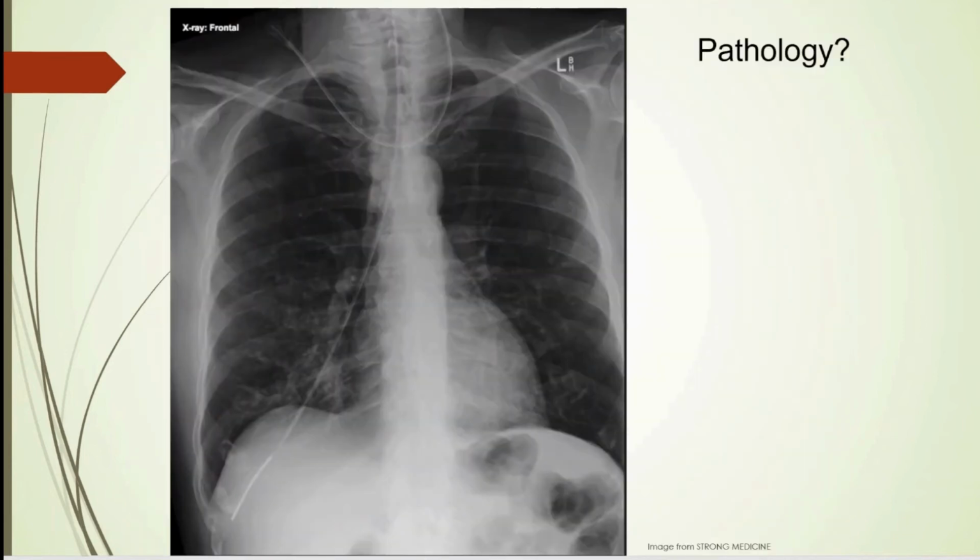And another chest X-ray. Let's start with the A for airway. Looks like it bifurcates there, so that's your Carina. And it looks in normal position, although you do see something coming down here, which looks probably like an NG tube. And if you trace it out, it goes down here for some odd reason. So why would an NG tube be in the trachea, the right main stem bronchus, and then down into the lung? Well, obviously it was misplaced, and they really put it down there. So right off the bat we found a misplaced NG tube.